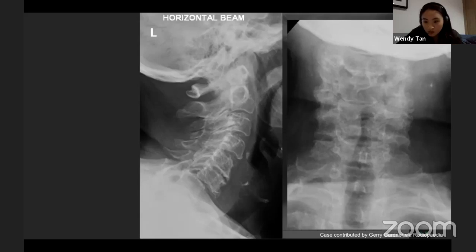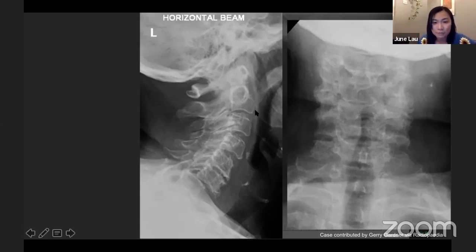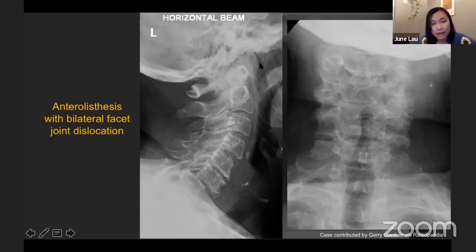Anterior alignment disrupted at C4. Narrowed disc spaces at C5, C6. Yeah. Great. So everyone's pointing out all the chronic changes, which is fantastic. But mainly, if you draw your anterior and posterior line here, you can see at the level of C6 it is disrupted. Here is your C7 vertebral body. So there is spondylolisthesis, more specifically anterior listhesis of C6 on C7.